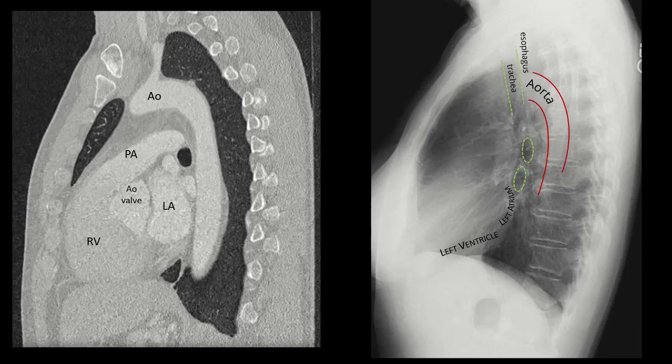Then on the anterior surface of the heart, just under the sternum, is the right ventricle. This ejects blood out to the pulmonary outflow tract of the main PA. The little arch just behind that and above the green circle is the left main bronchus. We can see the left PA just above the left main bronchus. Notice the lower circle is more oblong, and that's because it actually is the bronchus intermedius on the right side. Then we can also see the IVC poking up through the diaphragm.